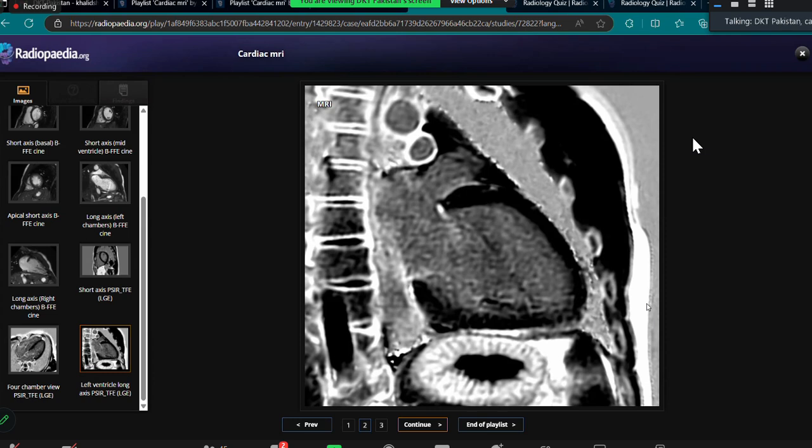It may be cardiomyopathy not due to ischemia but due to some other cause, as the patient is very young, just a 15 year old male. In dilated cardiomyopathy, if we look at the slide that I showed you, the function should be reduced. The patient has normal cardiac function. It is not reduced. Only dilated ventricles.